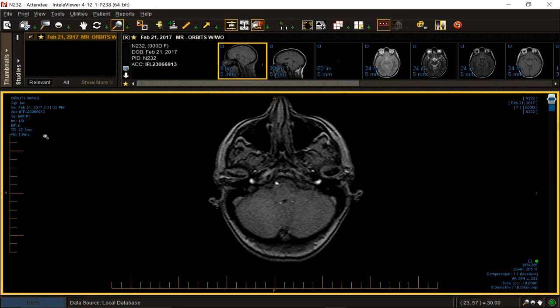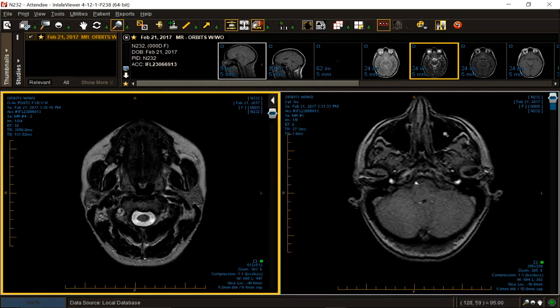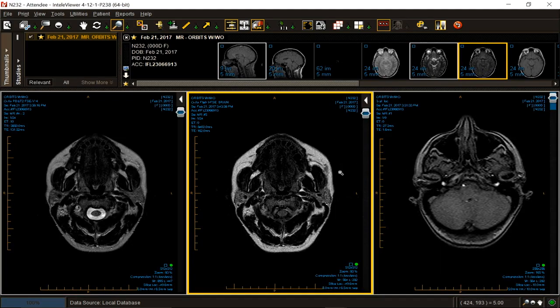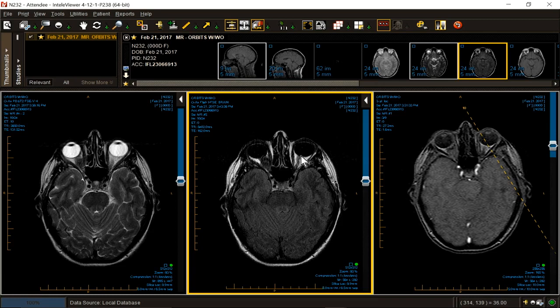Loss of vision. Right eye. Now, in cases where we're assessing proptosis, I like to do things rather simply. Kind of one of the official ways to evaluate proptosis is to look at the zygomatic line and see how many millimeters the sclera sits behind the zygomatic line.